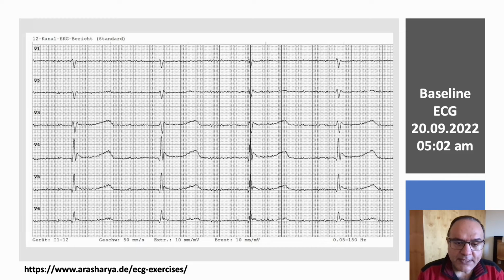So, what is the cause of Osborn wave? The heterogeneity of a transient outward potassium current is the reason that we observe Osborn wave. We have a dominant transient outward potassium current on the epicardial side, but not on the endocardial side of myocardium due to hypothermia.